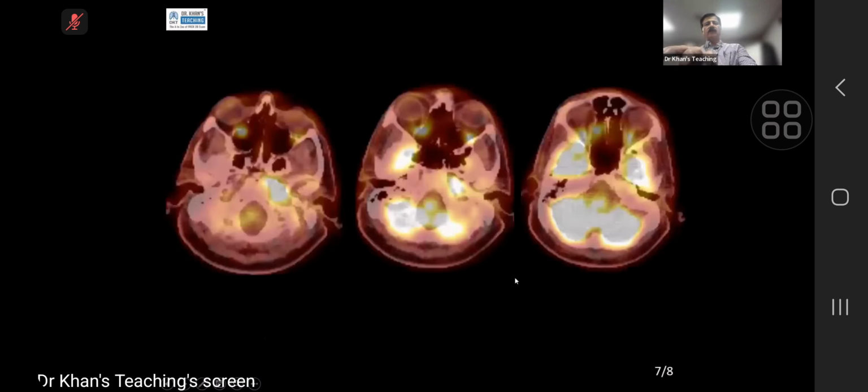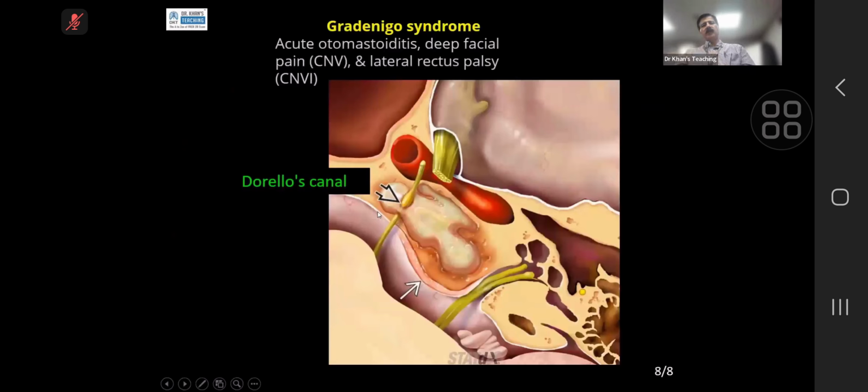Now, some of the other imaging was done, and I believe there were some doubts. Just to make a point, nobody is going to show you a PET for this, but this thing was on fire on the PET scan. You dealt with it very well.